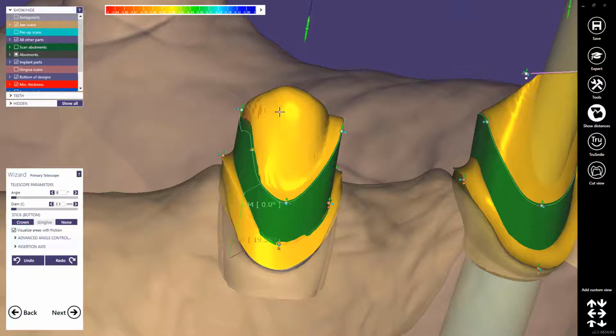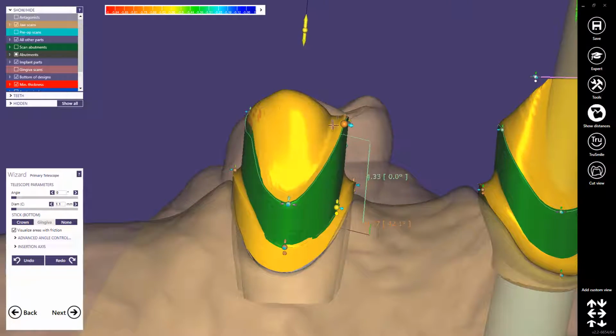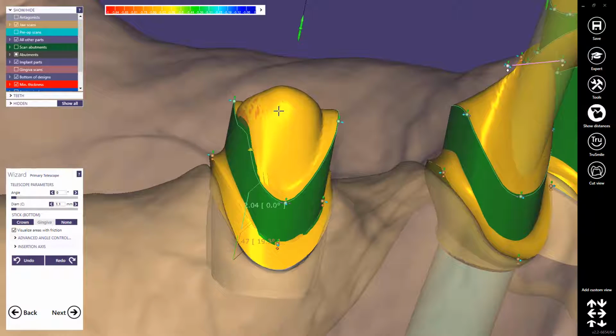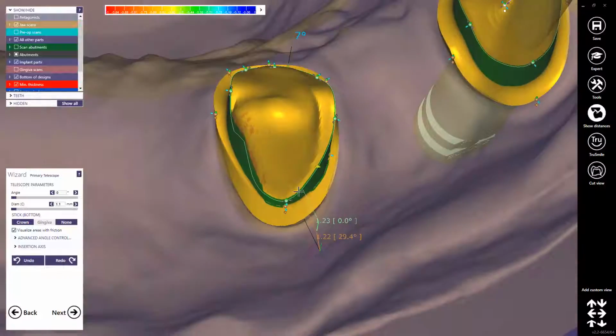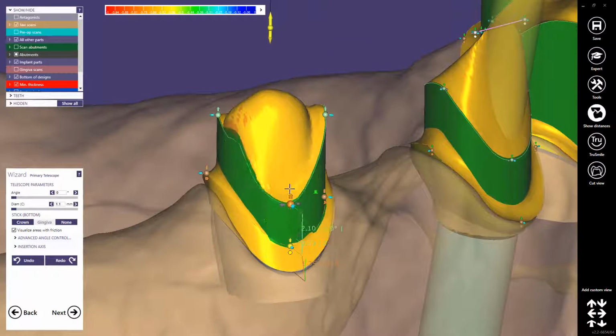What you should do is here on the proximal sides, just keep a little bit more than 2 mm. And I made the experience, if you have two opposing sides which are a little bit higher, then you will have a nice friction later. Even if you would choose the hardest case here, absolutely no friction area on the buccal side, that would also be possible if you have two opposing friction areas which are at about 3 mm.